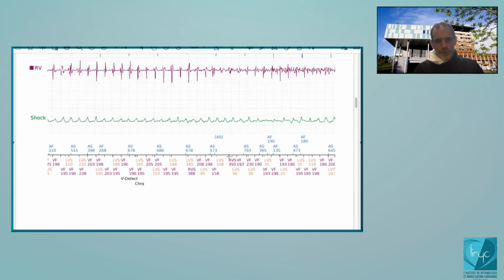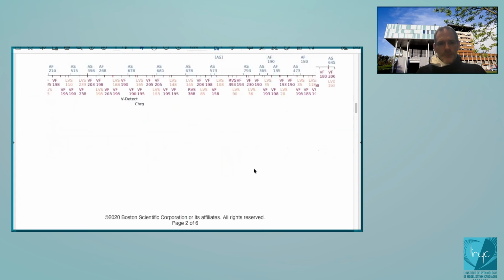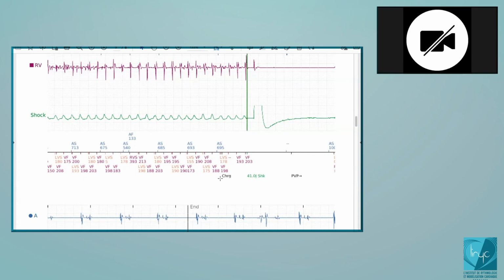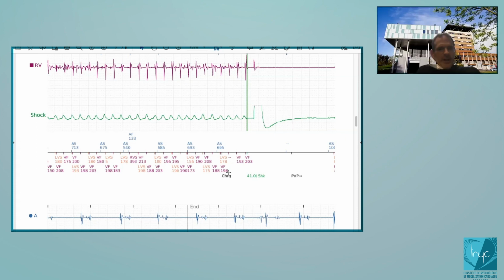There is one additional undersensing here, and then one cycle classified VS also. But you see that it's always verified that there is at least 6 out of 10. Okay, so you will go up to the end of the charge. Always verify on the cycle, and then you arrive to the end of the charge. So what happens here? It confirms that there's still the 6 out of 10 cycles in the VF zone, and so it has been verified up to the end of the charge.